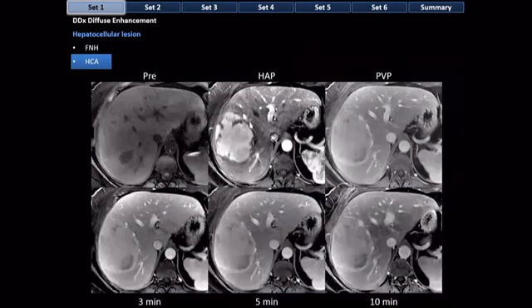Here is another hepatocellular adenoma. This is the inflammatory subtype. And notice again that we see in this arterial phase image diffuse enhancement, but it's heterogeneous, and the heterogeneity is not explained by central scar and radiating fibrous septa, and so we think this is hepatocellular, but not an FNH. And as Dr. Clausen said, these inflammatory hepatocellular adenomas tend to have telangiectatic change. They tend to have dilated sinusoids, so they hold on to the contrast on the delayed images. So notice that at 5 minutes and 10 minutes, most of this mass is hyperenhancing relative to the liver.